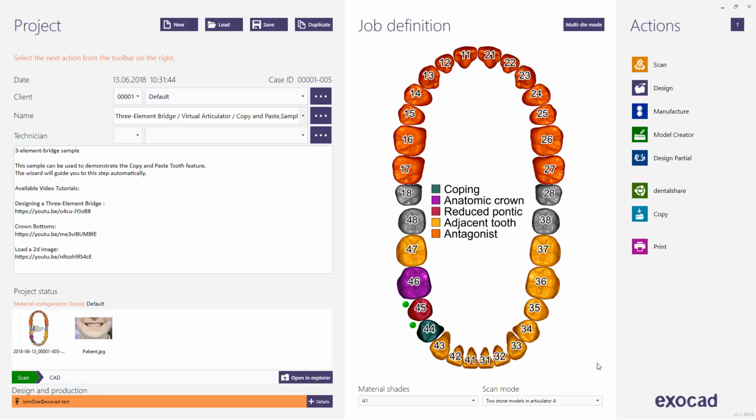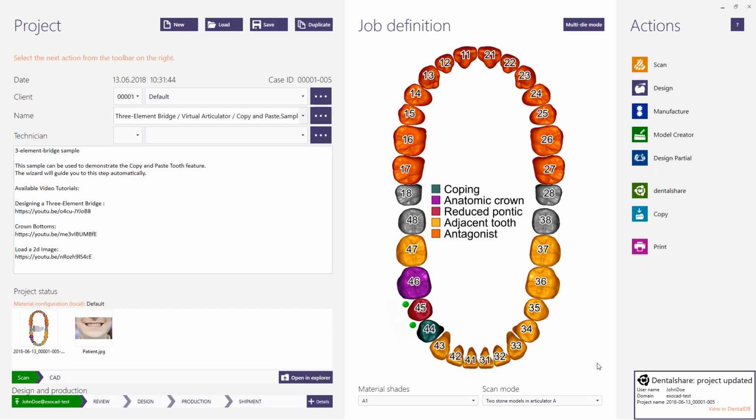Orange means that your case is still being uploaded. Light green indicates that the upload is finished. Dark green with a detailed status bar confirms that the case has been received by your contact. The status bar displays the various processing steps at your partner's facility for the services you've requested.